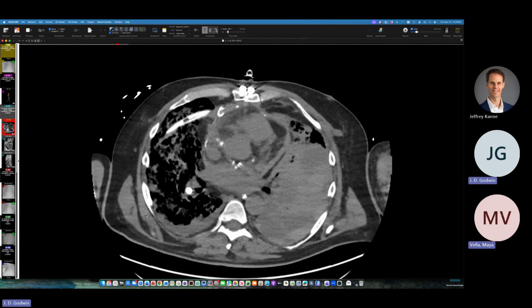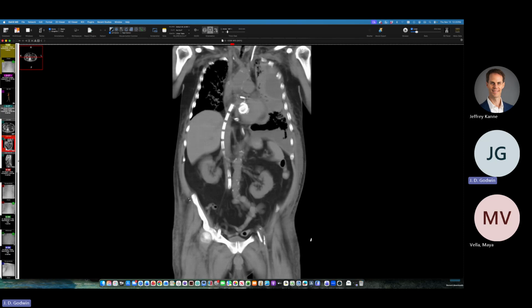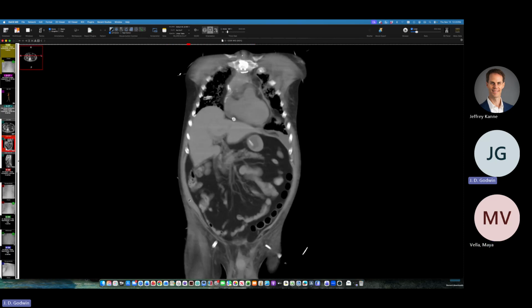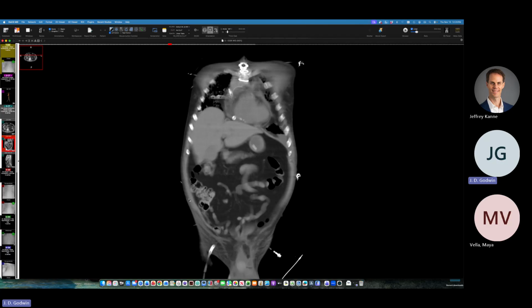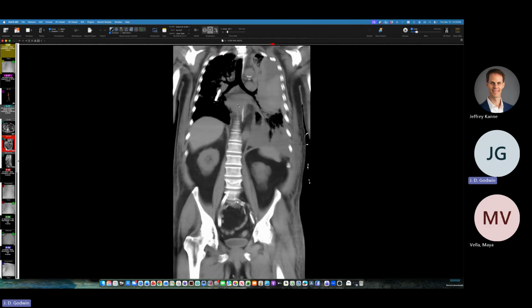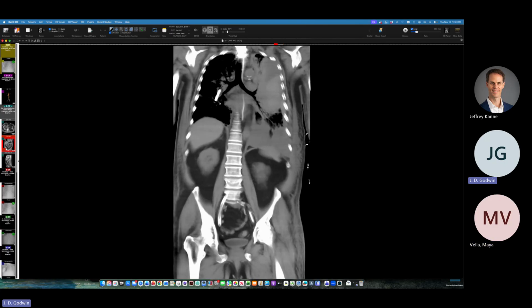Those are my cases. Those are great. Yeah, I haven't seen one embolized yet, but it's just a matter of time. In this person, it could have been because they went back in a number of times. This person had layers of surgery, and I think some of the surgery was after they'd already implanted the device. Here it is nicely on the coronal plane. So it may just be that they were in there instrumenting again, and that's what caused these things to launch.